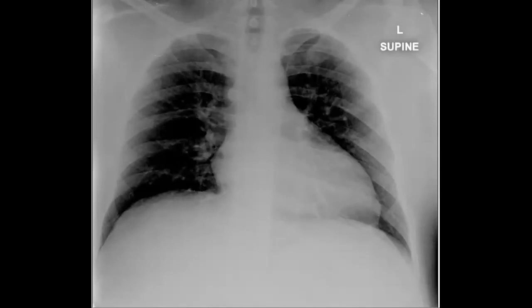So again, let's come back. So what do you think? This patient had an X-ray. I think the X-ray is so bad, but there is something which could be easily missed. If you check the shoulder here, it is a bit anteriorly subluxated, but this one, if you check the glenoid here, is anteriorly dislocated. So bilateral shoulder dislocation. Yes, bilateral shoulder dislocation. Okay.